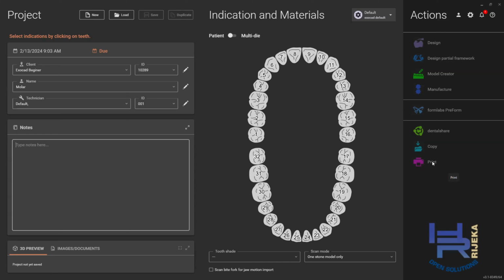In this track, we are going to have various different parts. In the first part, I would like to go through what we call in Exocad Dental DB. Dental DB is this exact first screen, which is where we import all of the information needed in order to carry out our design. It is very simple, but we have to absolutely fill it out correctly in order to move on to the next steps.